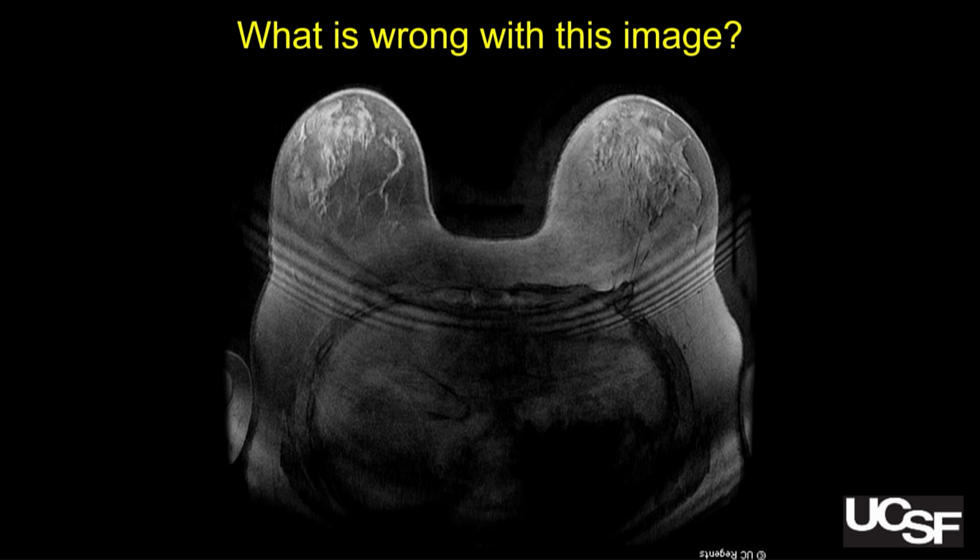So I told the person, tell the technologist, ask them, which way is phase going? Is it right to left or front to back? And they said, oh, phase is going right to left. Like, really? And then, bear in mind, I hadn't seen these images. So they did it again. It's still the same outcome. So I thought, well, it really sounds like a phase swap artifact.